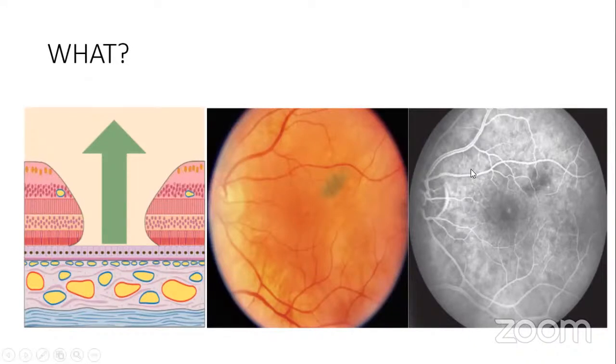Now, the vessel, the retina is full. There's some dye causing a laminar flow in the vein, and some of the veins are still empty. So this is an arteriovenous phase, okay? But if you look here, you see that there's still transmitted hyperfluorescence in the macula, just in the macula, representing the area of defect. You're seeing the background choroidal hyperfluorescence. Okay, so this is it.